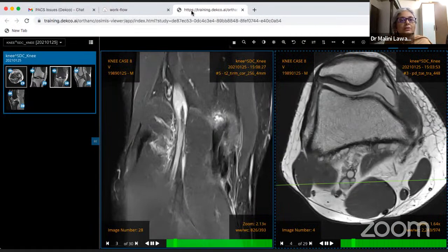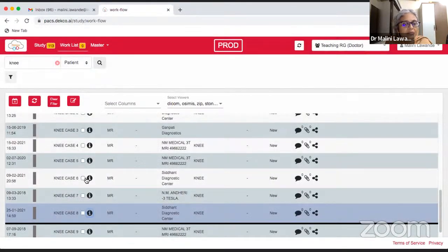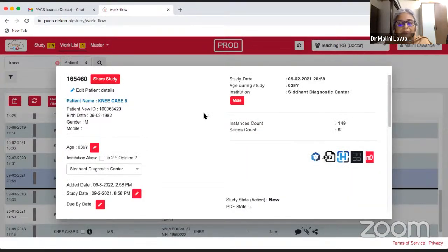Yeah. Inflamed synovium example. Okay, so let me see if the next case has it. If not, I'll just show it in my presentation. ACL bundles. Yes, sure. Let's try to look in the previous case, I think. Yeah. In this, because the ACL is not normal, I'll not be able to show you. Sure, let's look at the previous case. Give me a minute. Yeah. Let's look at the previous case because the ACL was normal there.